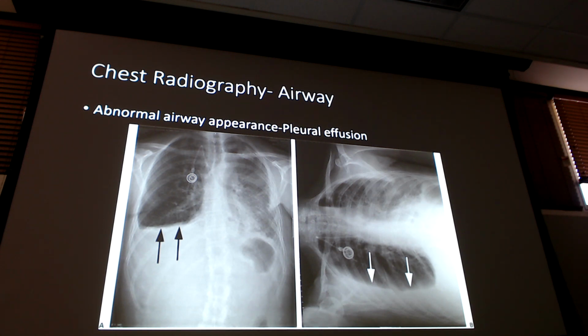Radiologists have measuring tools and things along those lines. When you do the decubitus, they know for sure that when you lie on your side, the lung tissue should go all the way to the thorax wall. So they can do some kind of funky calculation and figure out about how much fluid is sitting in there. It's kind of hard to tell from this one.